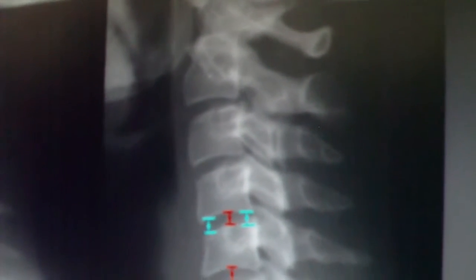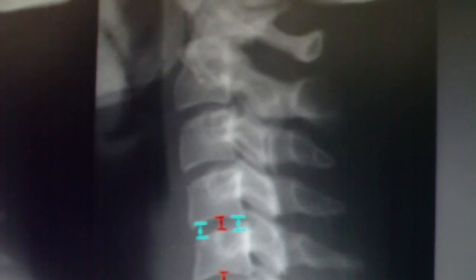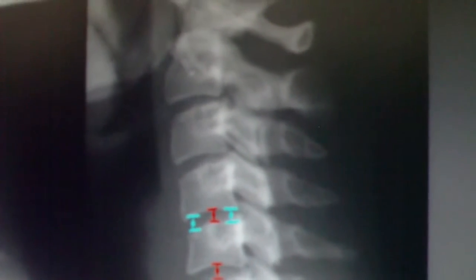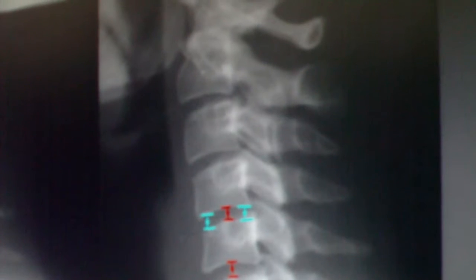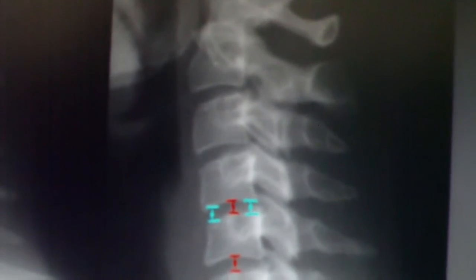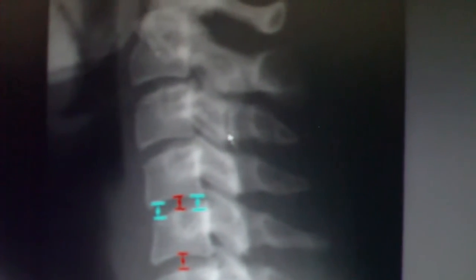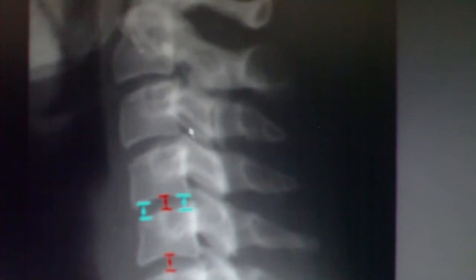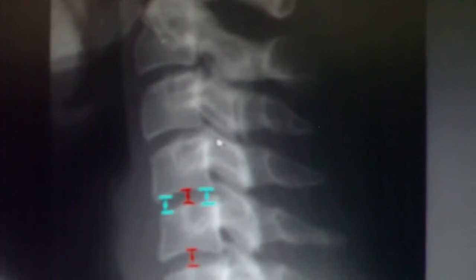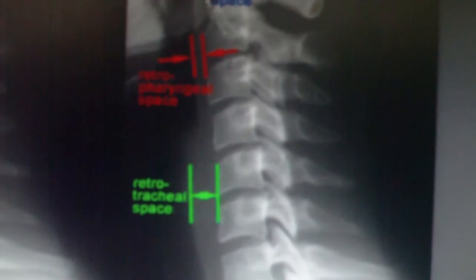So again, if my forearms represent the posterior aspect of the articular pillars, when there's rotation, they get out of sync, right? And then the synovial zygapophyseal joints with lateral bending, they'll get out of sync, so you'll see two lines. So again, this denotes or demarcates rotation. These two lines, lateral bending. And we don't see that so much here, but we do see it in the upper cervical.